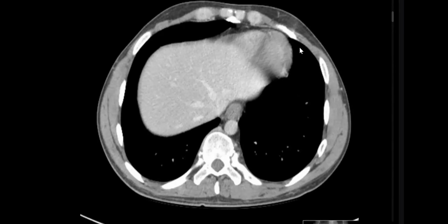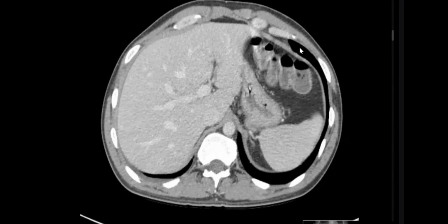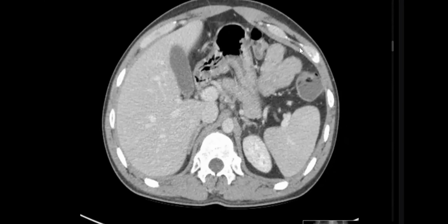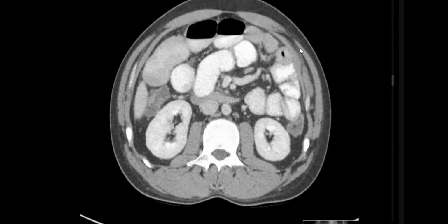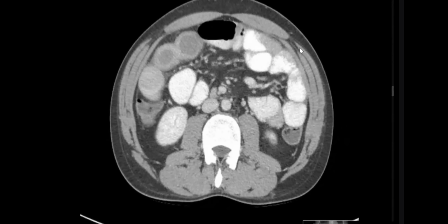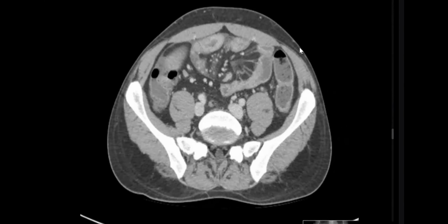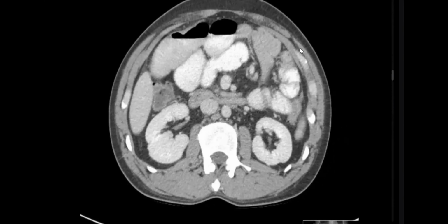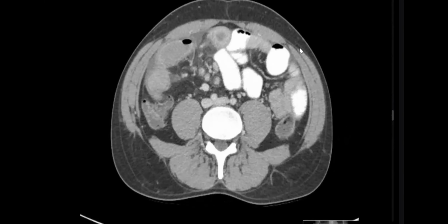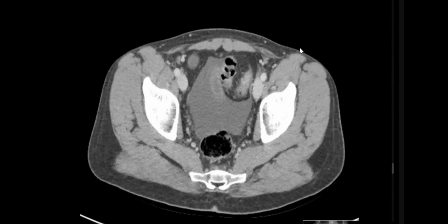Okay, you can proceed. One second. I'm scrolling now. I'm given a post-contrast CT abdomen, venous phase. I'm scrolling down now, looking for the cause of the obstruction seen on the previous radiograph. I see the liver, the kidneys are normal. I have not seen pneumoperitoneum. However, I'll still see the lung window to check again. However, the striking abnormality is this focus, it is small, but one second, I'm just scrolling to determine the bowel. Yes. Scroll till the end. Yeah, important step.